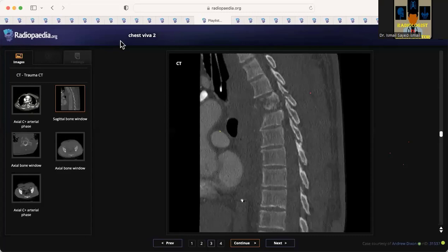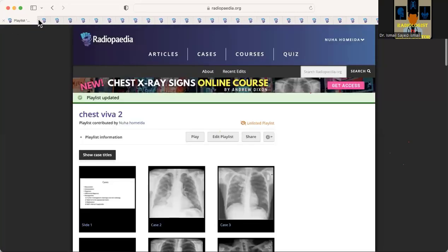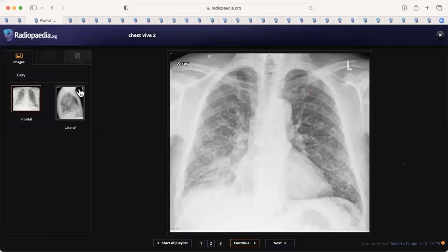So I'll just quickly recap what we've seen. This is a case of miliary nodules, and we said to look for other ancillary findings to give the giveaway diagnosis. Here there was opacity, so that gives the miliary TB. If I see clips within the neck, then it makes me think that this patient had a previous thyroid malignancy, and that's the cause. So always, when you find one finding, try and look for the cause. So that was a case of miliary TB.